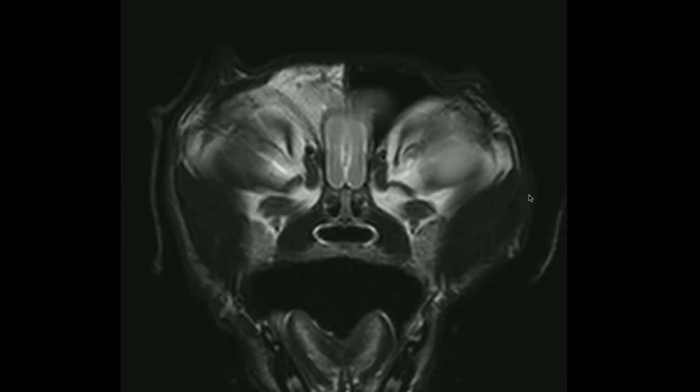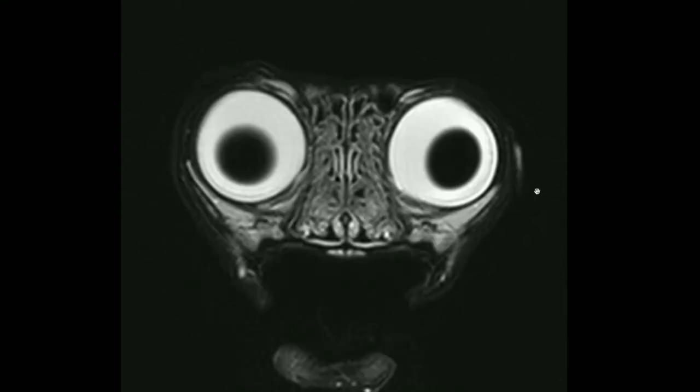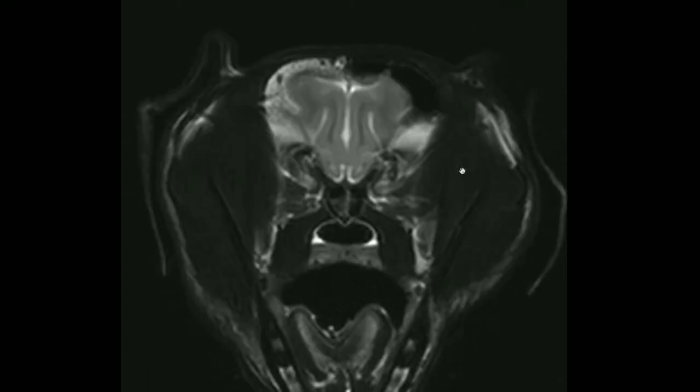This is the MRI, so we'll start off with the transverse T2 weighted image. The T2 is often the most useful series, so we'll just scroll through. As we go from rostral to caudal, we have a congenital anomaly of the frontal sinus, so I wouldn't be overly concerned by that.